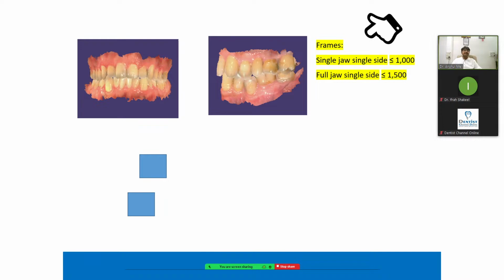So as you can see on the screen, this much of the screen frame should be recorded when you start scanning. That is the minimum frame. So you can increase the life of the scanner. If the number of scans is more, and the frames are more, then the life of the scanner will be less. Some of the doctors just scan to educate the patient. Yes, you should educate, but you should include the cost of the scanning, because the scanner also has a life.